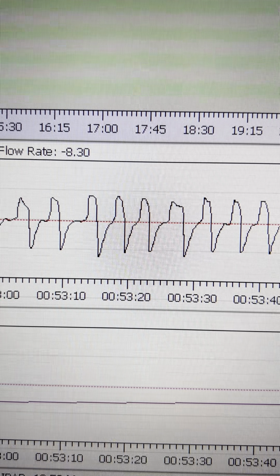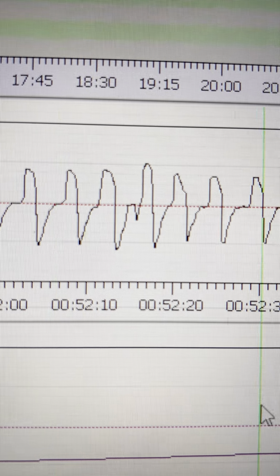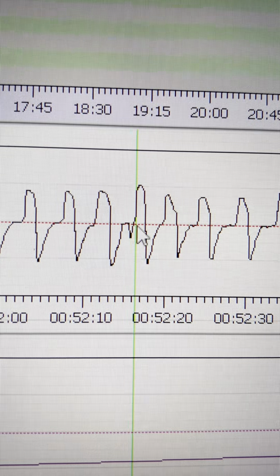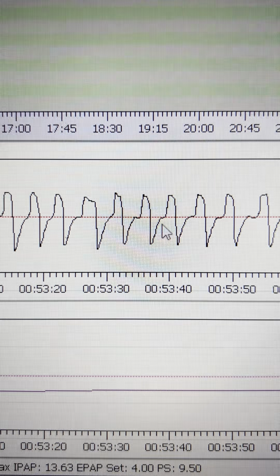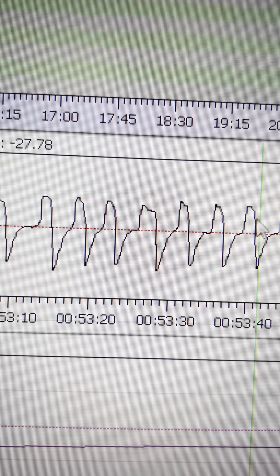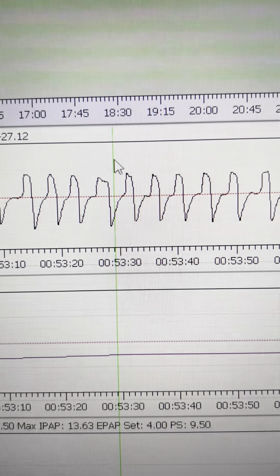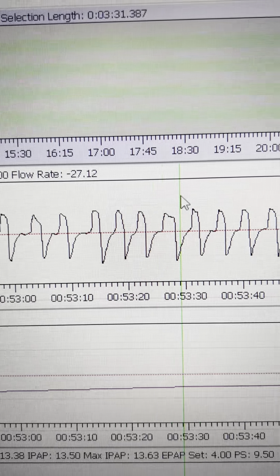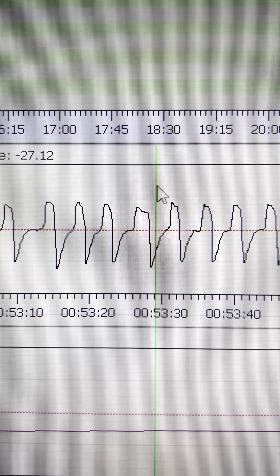So further, here you can see the same thing happens again. I would say this is also some sort of collapse or obstruction, whatever you want to call it. Even more proof of it. Here also rounding. And the thing is though, for me now, a lot of people would say, oh yeah, you have to up PS more here, right? But it's more complicated than that.